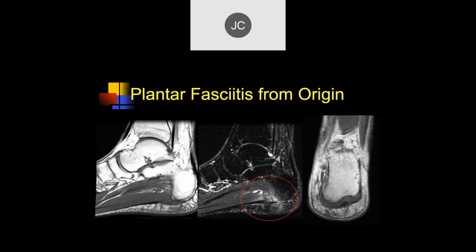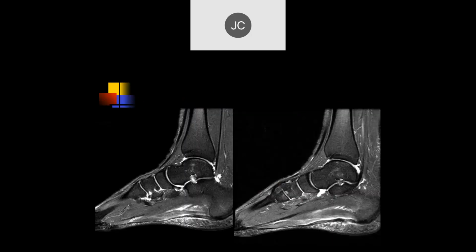The same thing with the plantar fascia. With chronic traction injury, you start getting injury to the tendon. It becomes thickened with increased signal intensity, which leads to weakening of the tendon and eventually a tear if you continue to stress it. Okay.